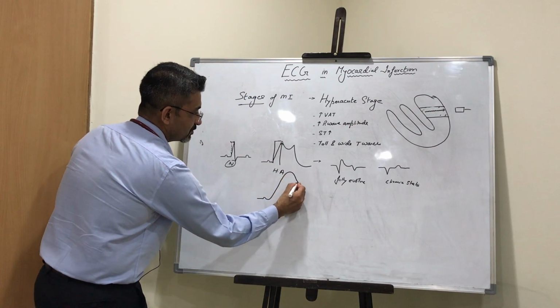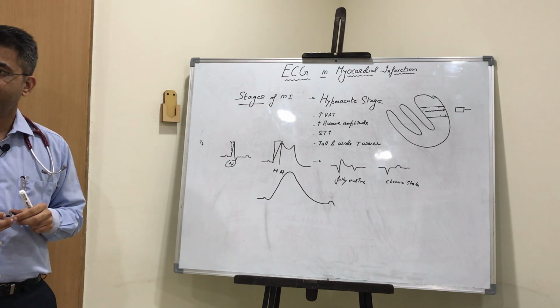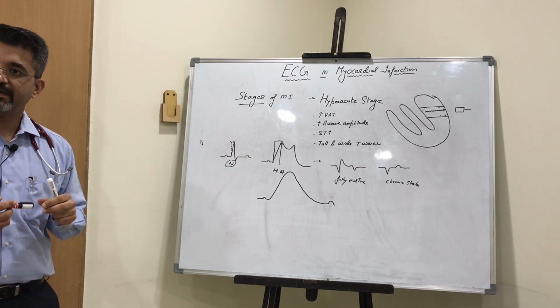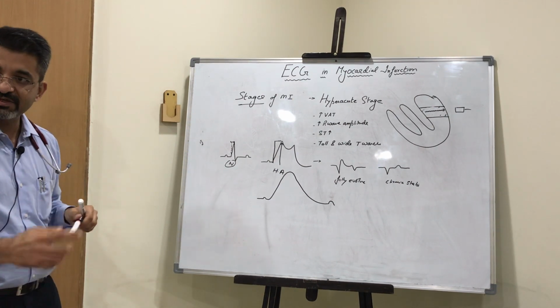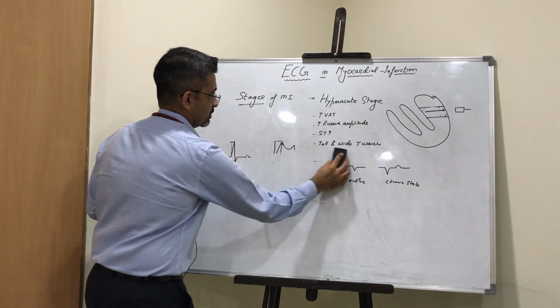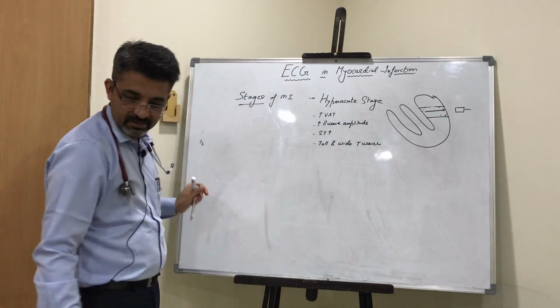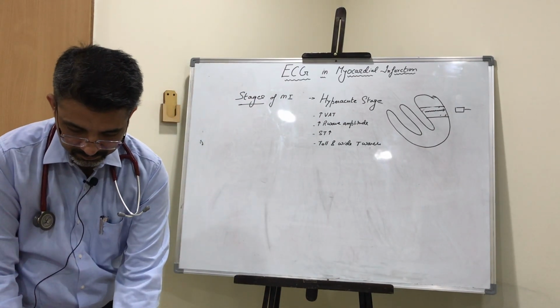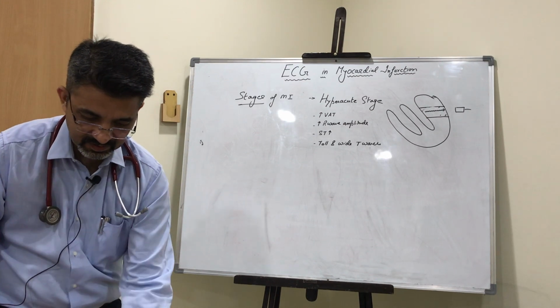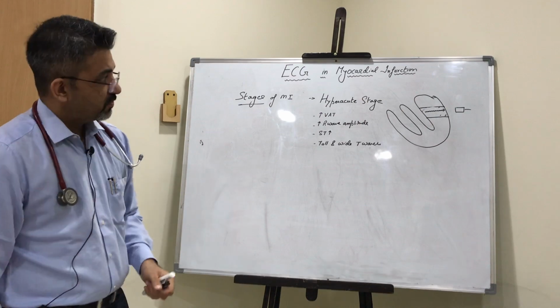you can have what we call as mergence of waves. Something like this. You will not be able to differentiate between your R, ST and T. It can be tall, very tall. You got the concept of R wave intensity, na? That myocardium is still viable.